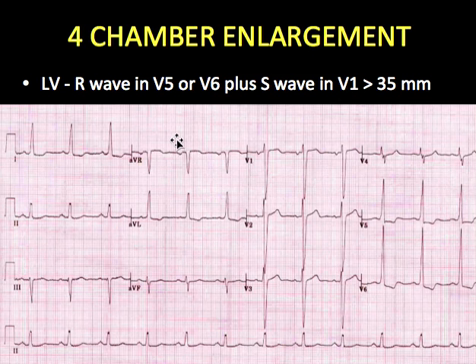So there are different criteria to call it left ventricular hypertrophy, because of the high voltage of the complexes. Now we know this is ventricular enlargement, and we will look at QRS, because QRS represents the ventricular activity. If we are looking at atrium, we will talk about the P wave. So this is the criteria to call it LVH by voltage criteria.